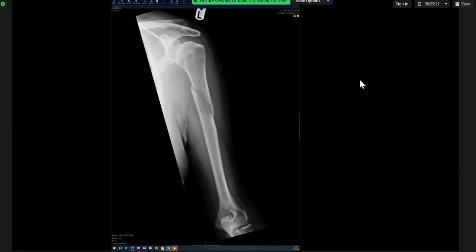In this age group patient, I would like to know the age of this patient, as my differentials would be dependent on that. 65. Yes. So at the age of 65, I would first consider the possibility of metastasis. A second possibility could be a myeloma. So I will review any previous radiographs to assess.